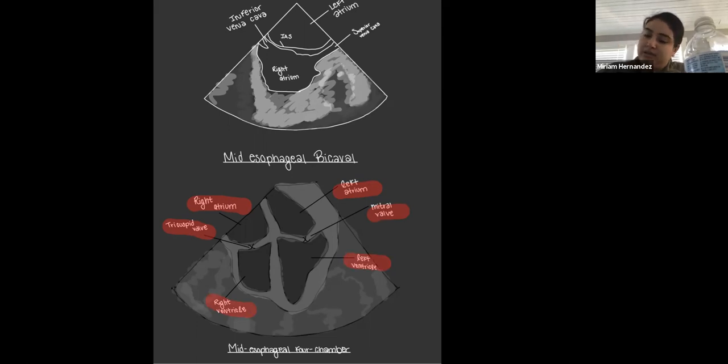And I don't have the angles for any of my images. Four chamber is 0 to 10 degrees.